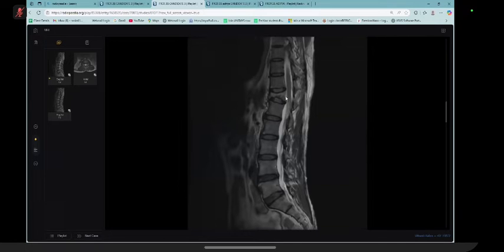This is a T12 wedging fracture. I can see that there is evidence of mild bulging through its inferior end. However, I couldn't see any evidence of spinal cord compression or any abnormal signal within the spinal cord. In this T2, I am trying to look, and I couldn't see any evidence of a prevertebral collection. Also, the intervertebral disc space appears normal.